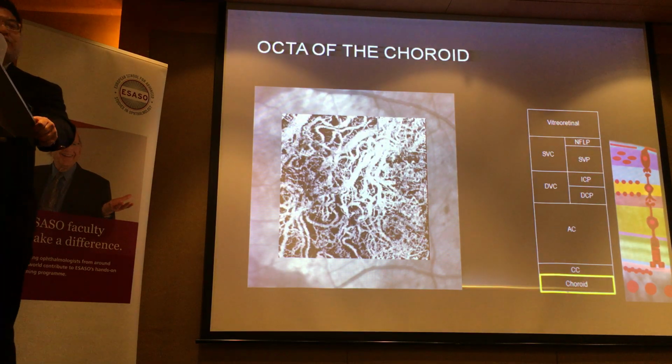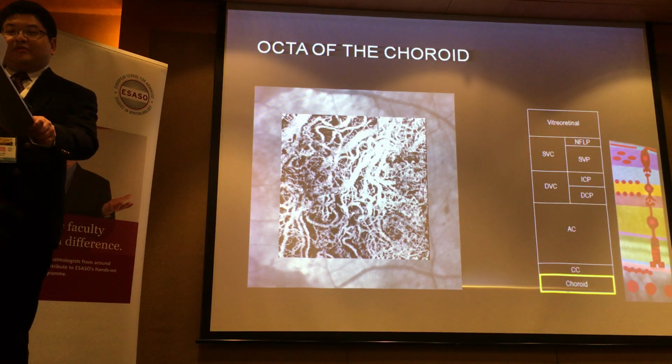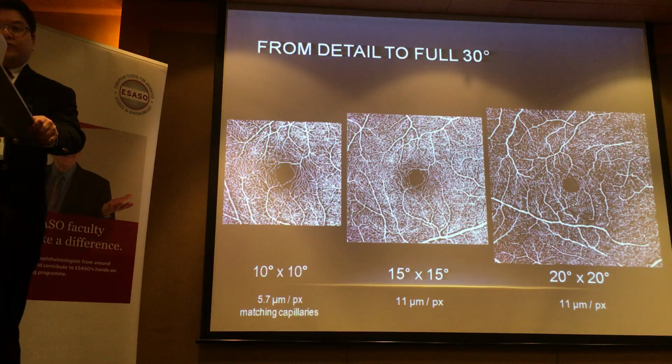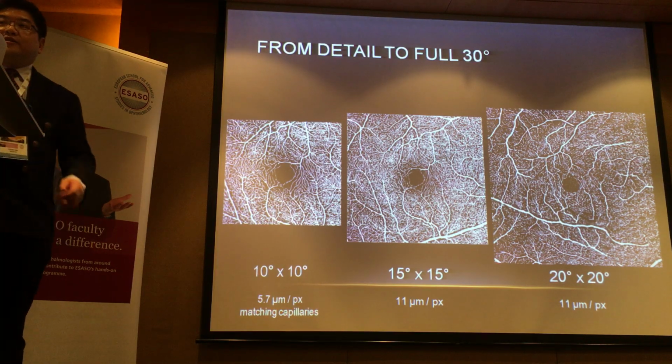And if you go deeper, you can actually visualize the choroid. This is not an ICG angiogram. This is the actual OCT-A. So it's quite impressive. And you can have different fields of view. This is 10 degrees. This is 15 degrees and 20 degrees.